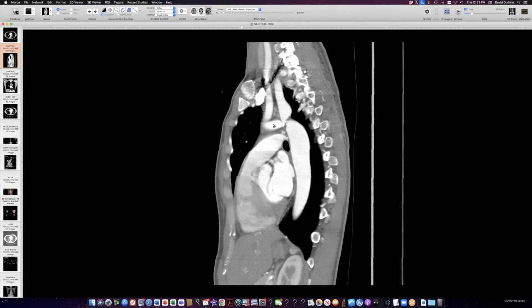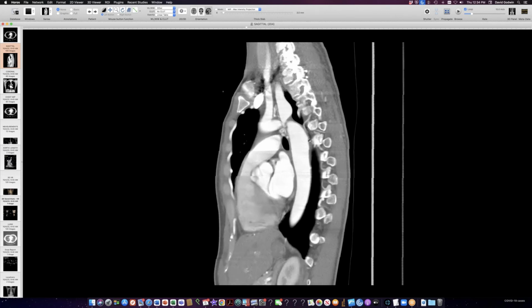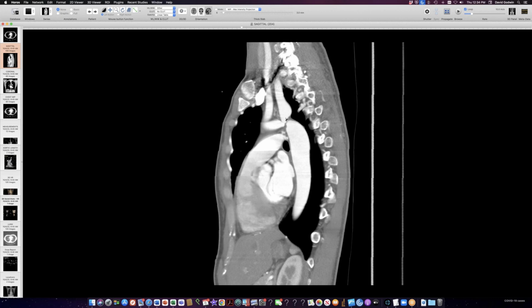So with coarctation, because the arch often tends to be hypoplastic, as in this case, that's why you don't get a very dramatic 3 sign with most cases of coart. If you do see a dramatic 3 sign, it's probably not a coart, it's probably a pseudocoart.